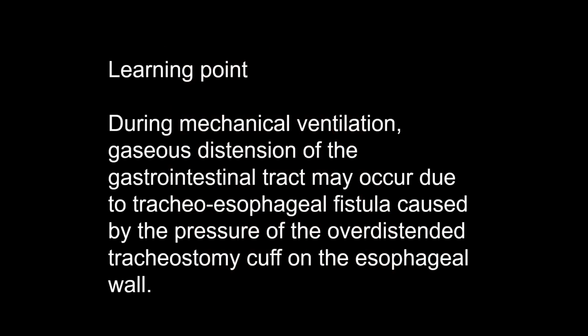Our learning point is that during mechanical ventilation, gaseous distension of the gastrointestinal tract may occur due to tracheo-esophageal fistula caused by the pressure of the over-distended tracheostomy cuff on the esophageal wall.